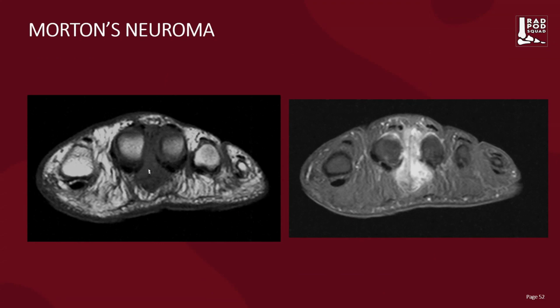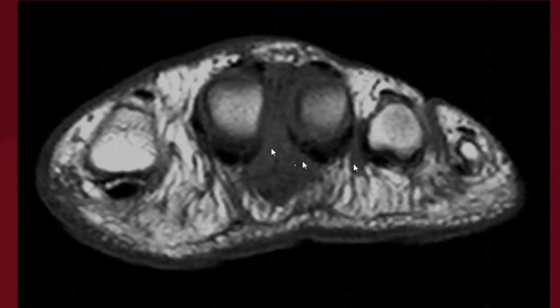So Morton's neuromas are neuromas that occur in the midline and are felt to be compressed against the deep transverse intermetatarsal ligament at the level of the metatarsal heads. And we can differentiate that from a pseudoneuroma, which is felt to be eccentric perineural fibrosis closer to a plantar plate capsule. It's important to differentiate between neuromas, which are central, and eccentric pseudoneuromas because the treatment for plantar plate is very different from the treatment of Morton's neuroma, and we can improve patient outcomes with early, accurate diagnosis.